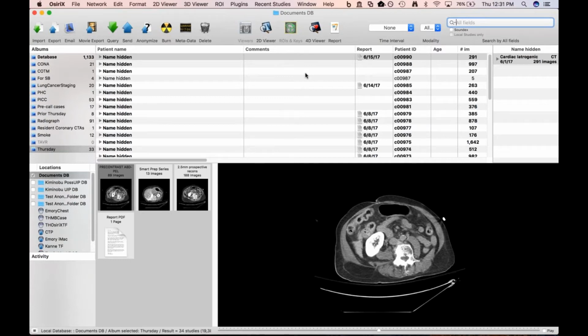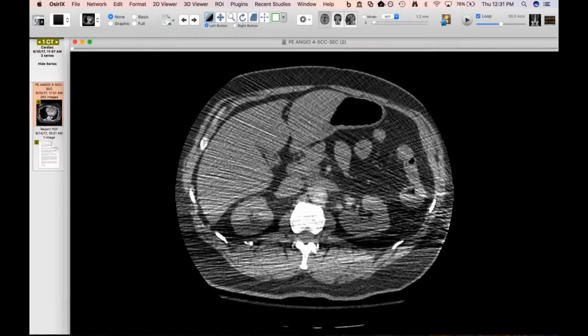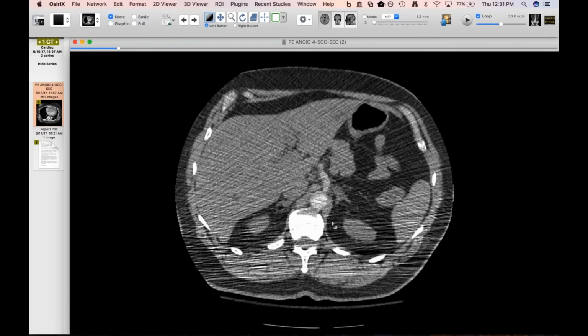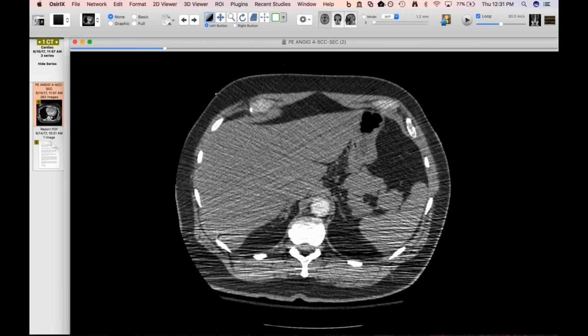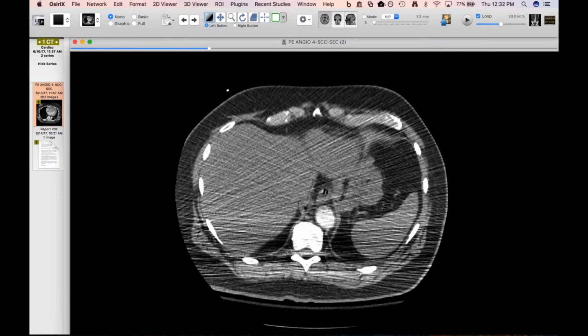All right, I'm going to start with this case. I've got a couple of truly shocking cases that don't have anything to do with pacemakers, but Brent and Art and all the cardiac guys there will love this one. Unfortunately, it's a terrible exam from an outside hospital. This is a middle-aged woman, no past medical history, who presented with chest pain and rapidly developing hypotension.